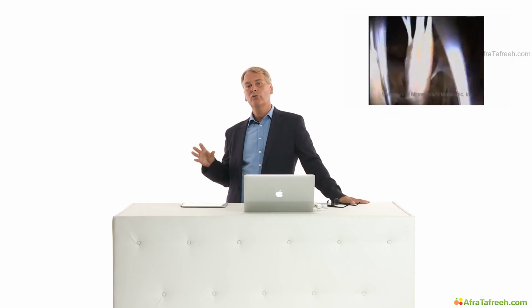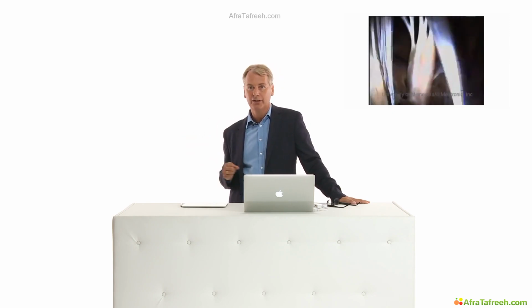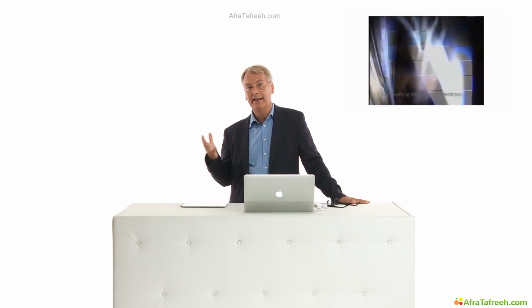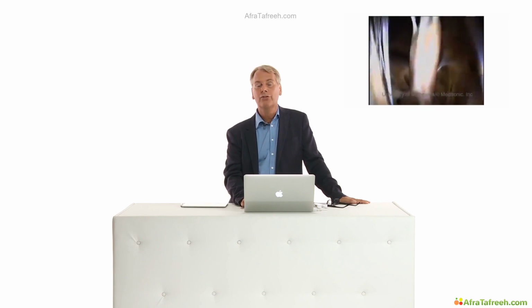And here is a video that shows you the papillary muscle of the right ventricle. Now, the papillary muscles of the right ventricle are usually not so well grouped as those of the left. You have them dispersed throughout the, I would say, lateral and anterior wall of the right ventricle. And you see that those trabeculations, especially if you hit them orthogonally, sometimes can appear as if they are a tumor. The second structure that you could mistake for a tumor is the moderator band.